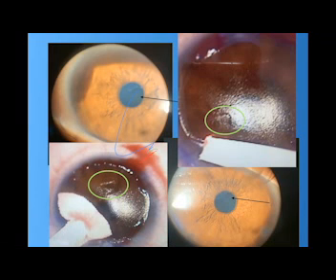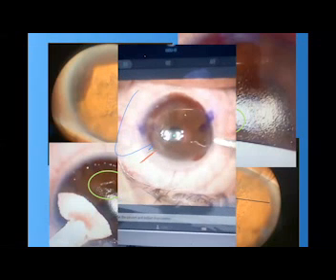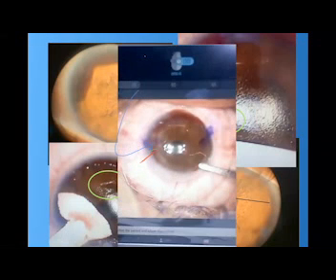This is the point of scarring in this part of the superior stroma, and this point explains the thinnest, explains the steep, explains the shifting of all the figures, ups and downs. So this is the flap, and this is the bed showing these scars or after-scars. So all the irregularities are explained now, and I could go for refractive surgery.